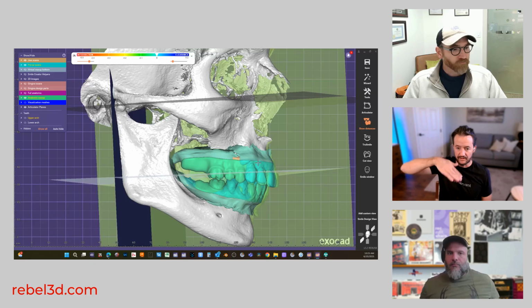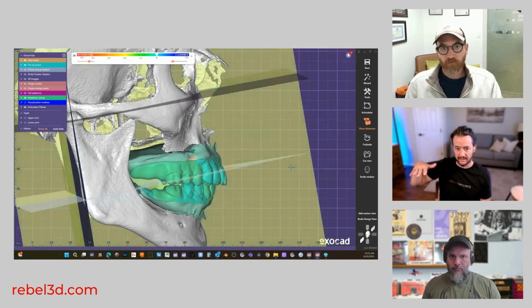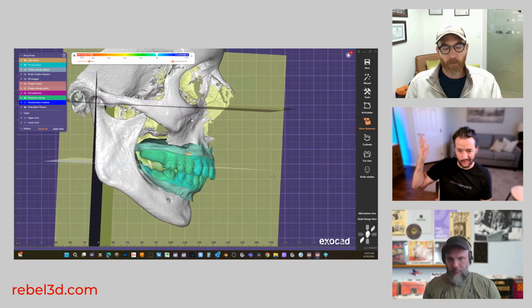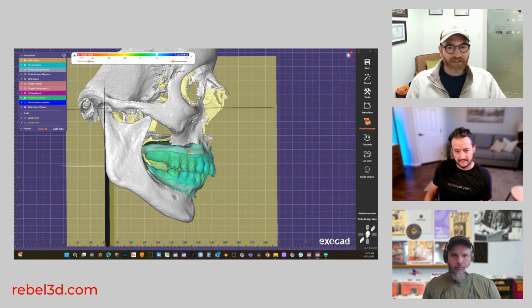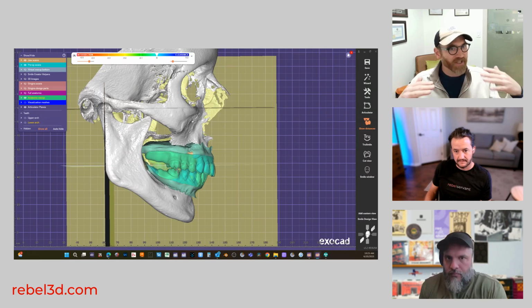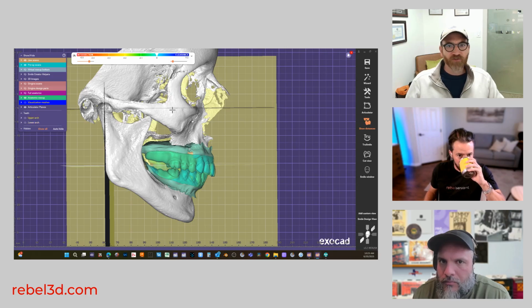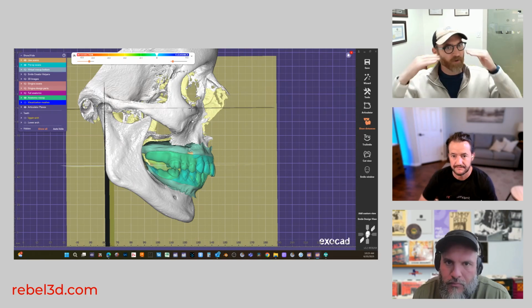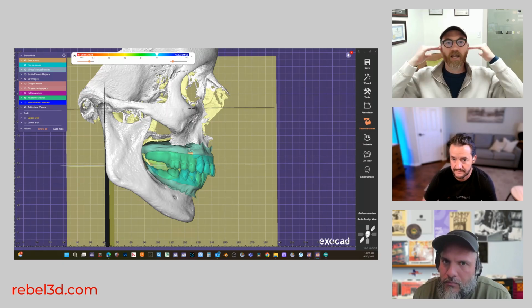Dr. Sven, I noticed your mounting is angled and goes deeper into the occlusal plane than Daniel's mounting did. Why is that? So there's Camper's plane, right? The occlusal plane is typically what we call Camper's plane. A lot of setups like the removable are set up as Camper's plane. And that's why we use the Frankfurt horizontal plane as our anthropologic norm of how we look at a face. Okay, and when you take your photographs, you want to capture this Frankfurt horizontal plane. Camper's plane is about 7 degrees off of that.